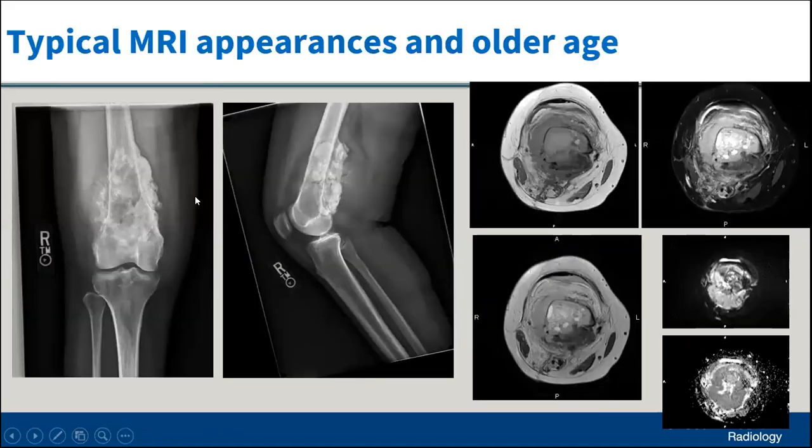Now, osteosarcomas like this, big ones, showing the lesion on different sequences, very dark on ADC. It's a high-grade osteosarcoma, very easy call. And you've got to measure where the lesion is bright or where the lesion is enhancing, not where the fibrous tissue is, which is dark. Find the bright area, find the dark area, and then measure there.